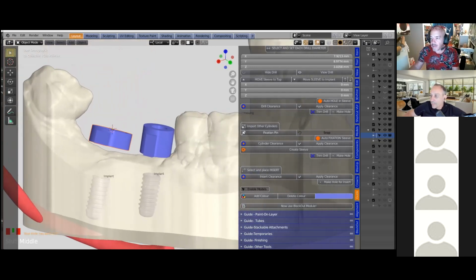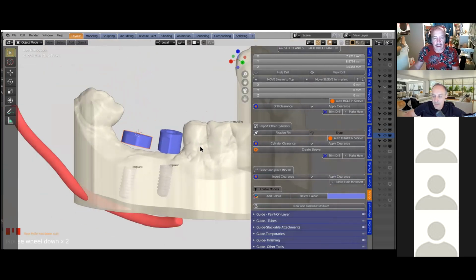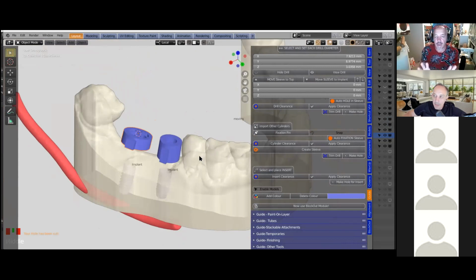All right, so that's good. Now, we've done everything we need to do with these implants. We have to focus now on the guide. How much time do we have left, Wolfgang? Well, maybe 5 minutes. Yeah, so the thing is, we've gone very much in detail with everything.